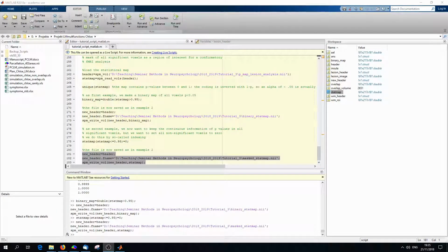So this was a tutorial on how to load and process images of brains in MATLAB. I hope this is helpful in your career, and I think many of you will work with brain imaging in the future, for example with SPM, and there are a lot of standard functions. For example, if you open the graphical user interface, these are often used in fMRI analysis and so on. And SPM has a mailing list. There you can just get the emails where a lot of people ask questions, and after some time I realized many questions could be solved just by programming stuff yourself.